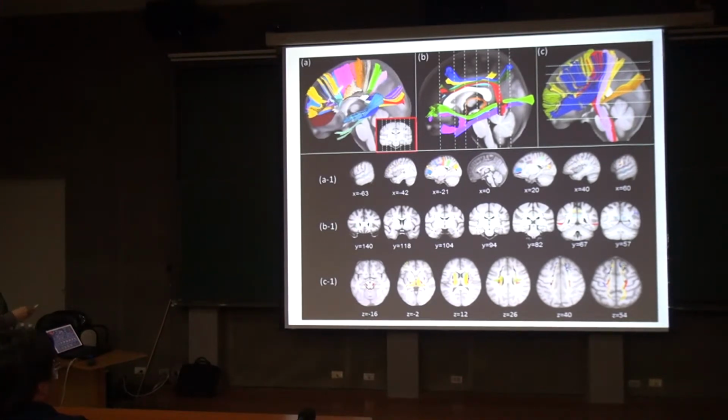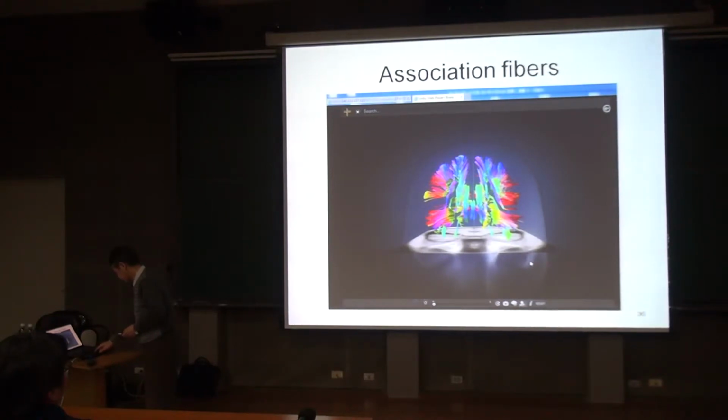And then I determine the brain fibers. There is a very nice organization of the brain fibers. I'll show you the movie of the brain fibers.